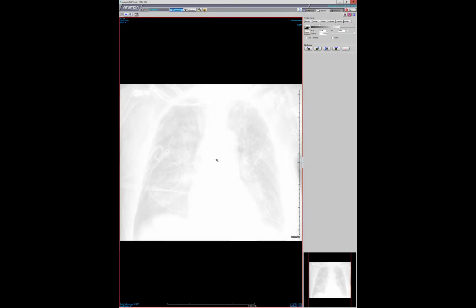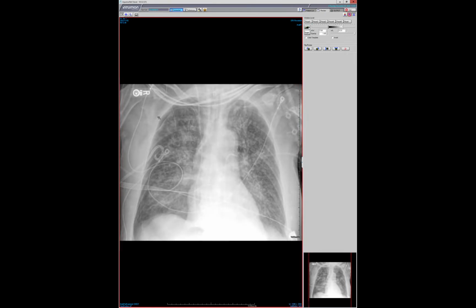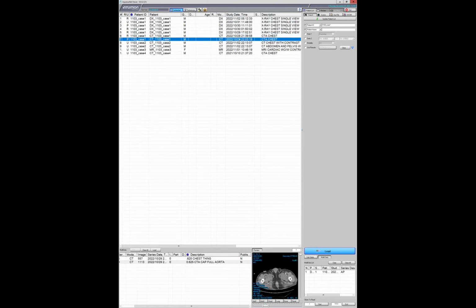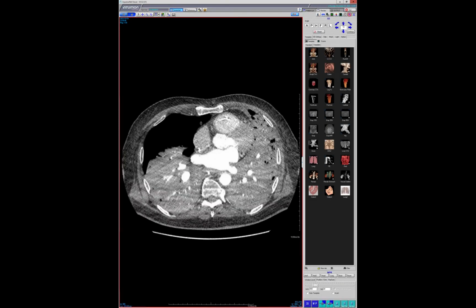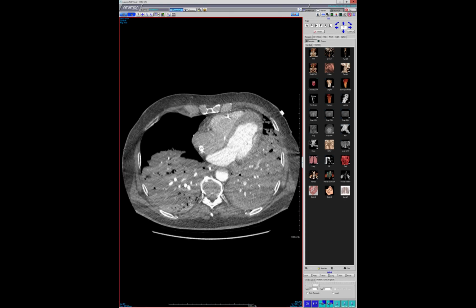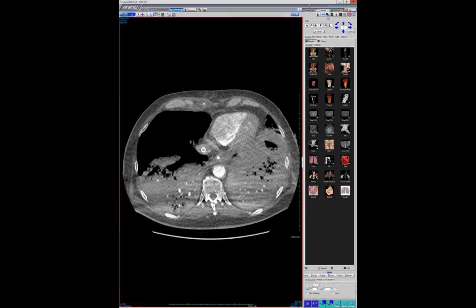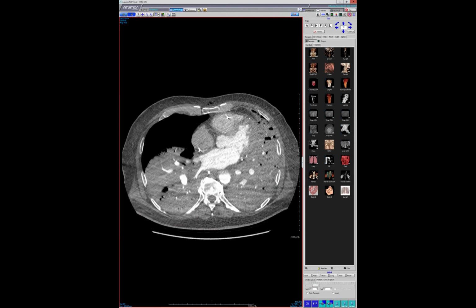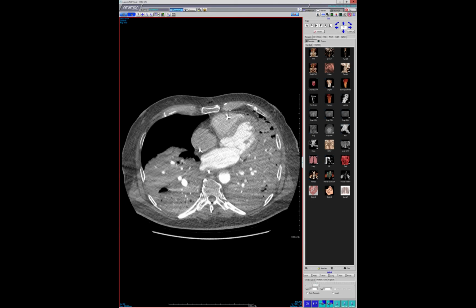And what is amazing is that I've never seen lungs go, in a day and a half, from this, where he's clearly edematous, to basically a pattern of mild to moderate edema in 36 hours. I just thought it was really impressive how much of this cleared out. And presumably, the question is then, what is this? It's not going to be pneumonia.